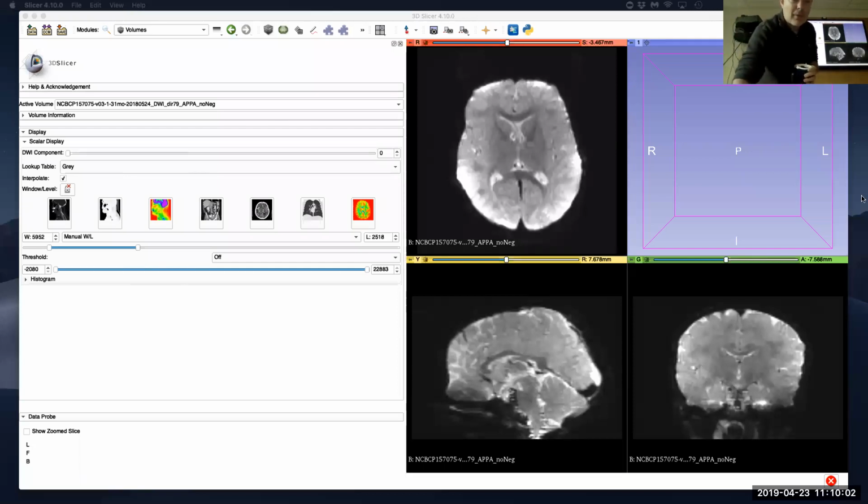I hope that everybody can see this Slicer. So this is Slicer. I've loaded a baby connectome dataset. You can see here, of course you can't read it in the back, this is a 31-month-old subject. I actually don't know whether that was a sleep scan or an awake scan. 3 years is a tough age to actually get good scans. That's also the reason why I chose it, because I expect to see some motion and so on. So it's a bit more interesting to look at.